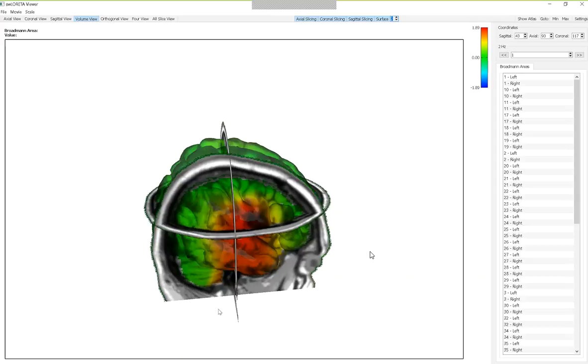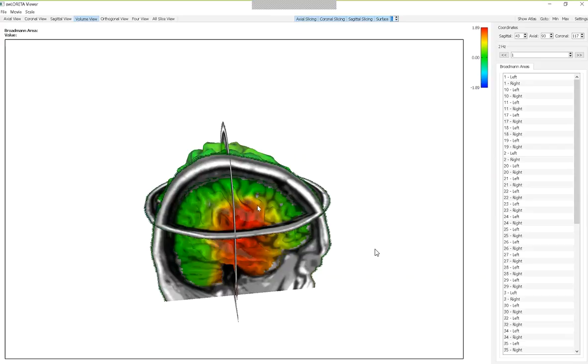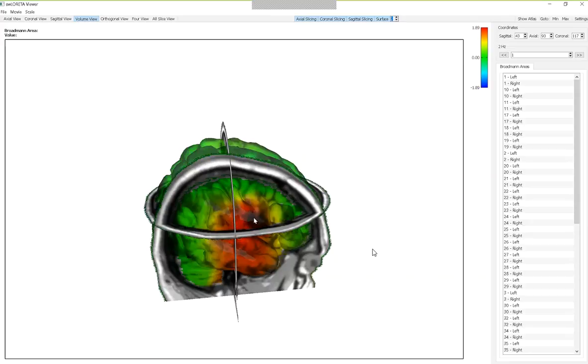Now this is the surface sources, and you can see they're quite red. Now we're going to go deeper. You just click and now we're at the bottom surface, and you can see it's a smaller area, and there's yellow around the boundary. That's because there's less current density in the sources in the depth of the cortex as opposed to the sources at the surface.